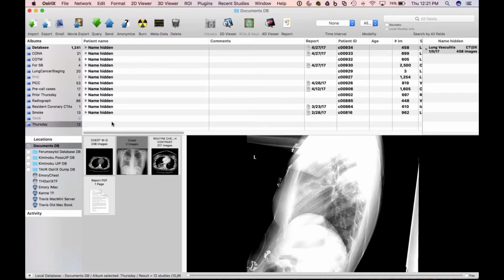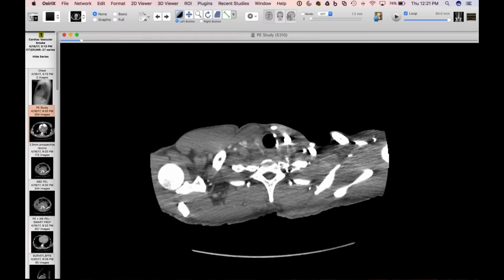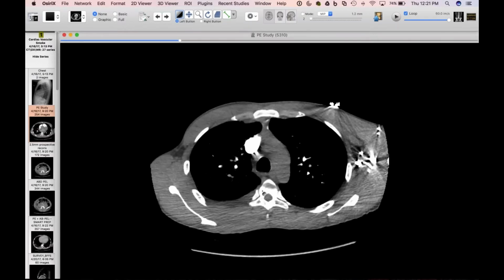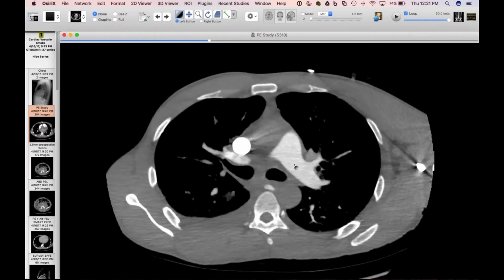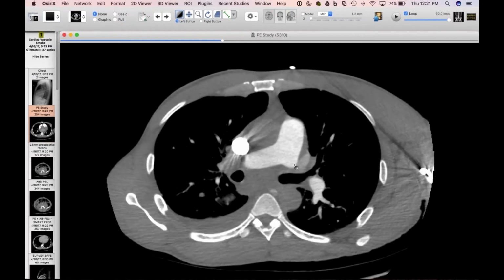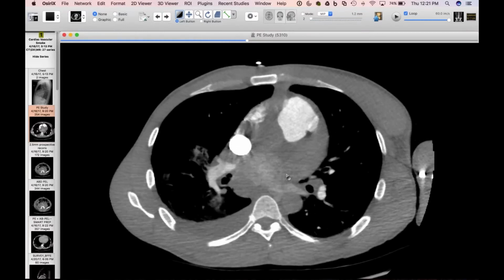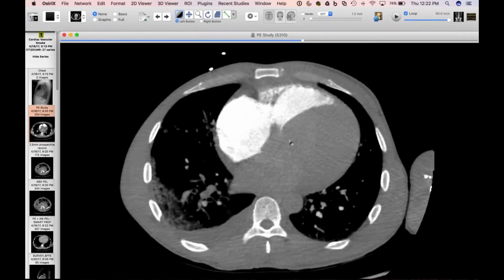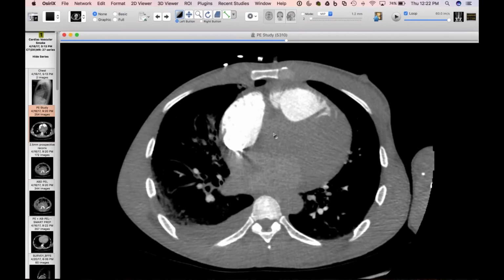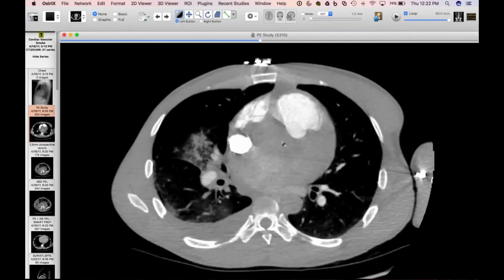Now this next one, let's see, right there. This is kind of along the smoke theme, and I don't know. I'm becoming more and more inclined to think we should never time pulmonary emboli studies off the PA, because if patients have any heart disease, you frequently end up with something like this. And of course, I tell my residents, if you ever have a PE study that's apparently timed this well, it's not due to the scanner, it's due to the patient having heart failure.